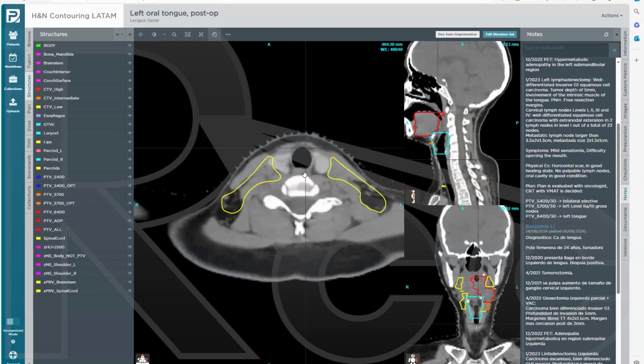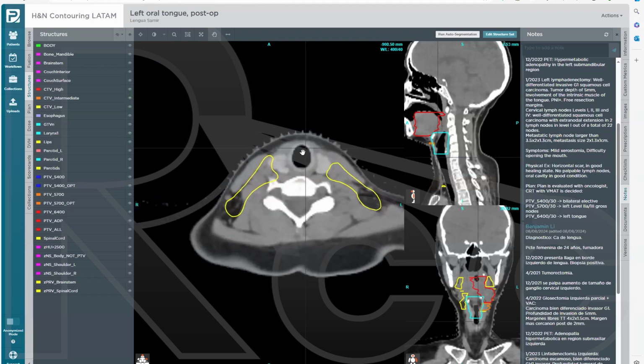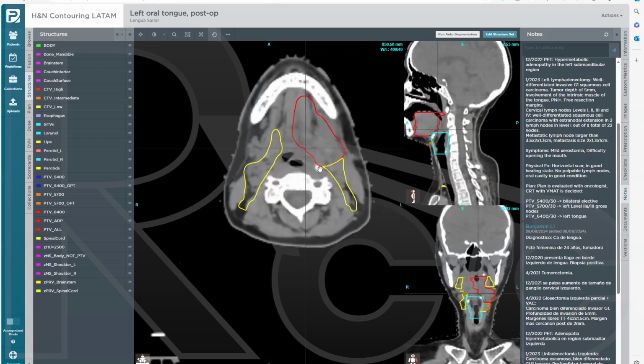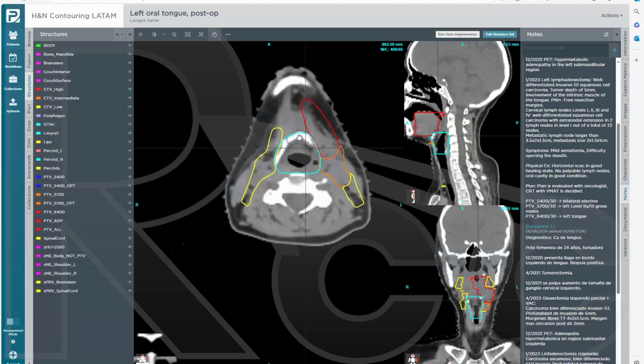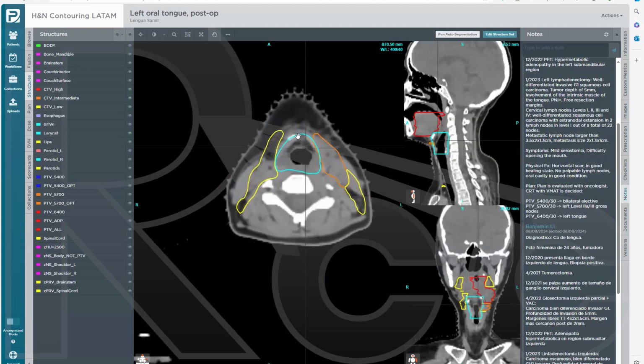Okay? So this is one thing, the transition here. Same thing for the transition for the hyoid. People say, well, hyoid is here, right? No, we're talking about the body of the hyoid, right? So this is the body of the hyoid right here. And that's where we want to use the bottom edge of it to start the transition of level 3.